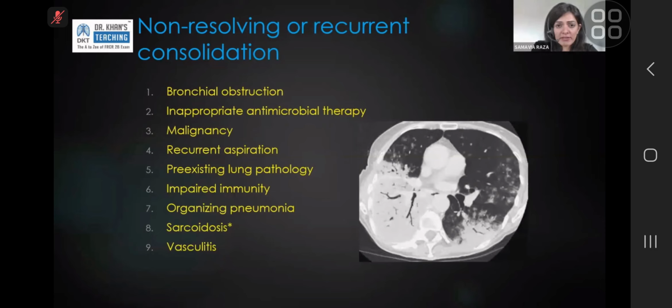And the issue with non-resolving consolidation is that when we have a very textbook looking pneumonia, we automatically think, oh well, this is infection. Oh well, I forgot to recommend a follow-up. What does it matter? If they were asymptomatic, it means that it has resolved. The guidelines, the recommendations, are that when you see something on a lung on CT that worries you symptomatically or radiologically, and the same for chest X-ray, you need to recommend a 6 to 8 weeks follow-up.